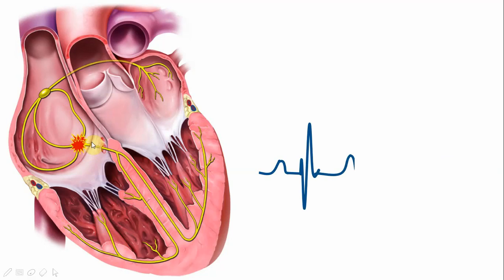When the cardiac impulse passes through the normal conduction system, we get the QRS complex. Normally, in a lead, you will never see Q, R, and S all three together. Either you will see Q wave and R wave, or you will see R wave and S wave. As the cardiac impulse goes to the ventricles, there is repolarization of the ventricles after the depolarization, and that is represented by the T wave.